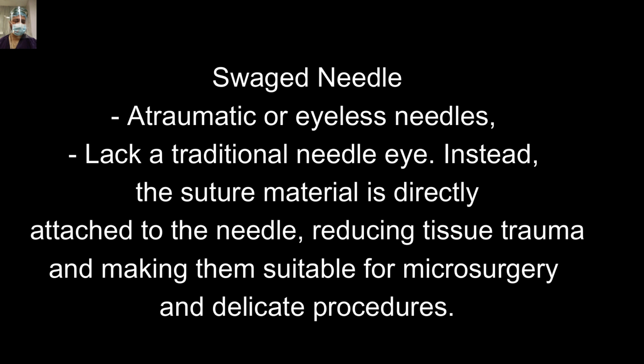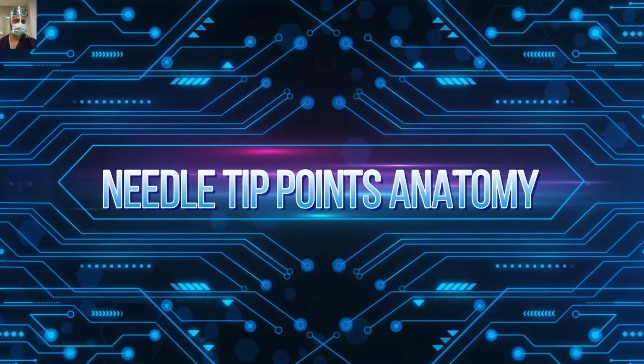As I said, these swaged needles are atraumatic and eyeless needles, lacking a traditional needle eye. Instead, the suture material is directly attached to the needle, reducing tissue trauma and making them suitable for microsurgery and delicate procedures. Now, needle tip point anatomy, friends.